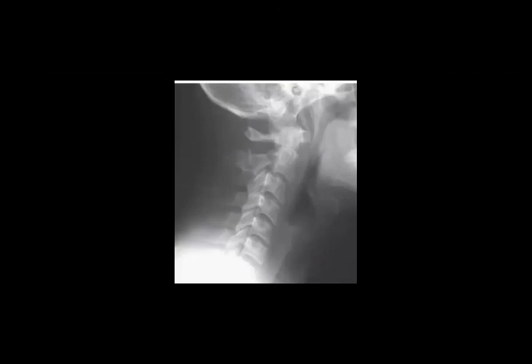Okay, I will show you the CT of this patient. And now the second stage of our session today. So this patient, as you see in the CT, has similar fractures, and it involves the lamina and the pars. Yeah, so multiple fractures, unstable fracture. Okay.